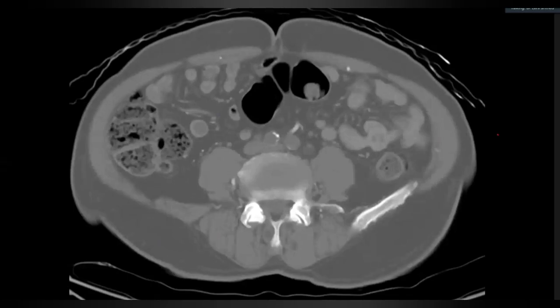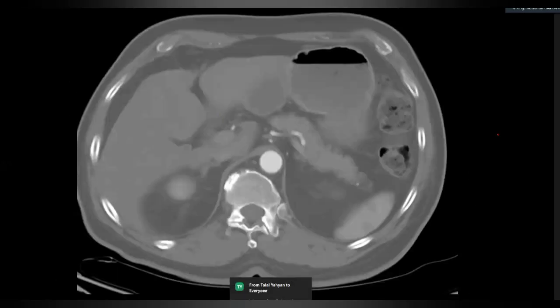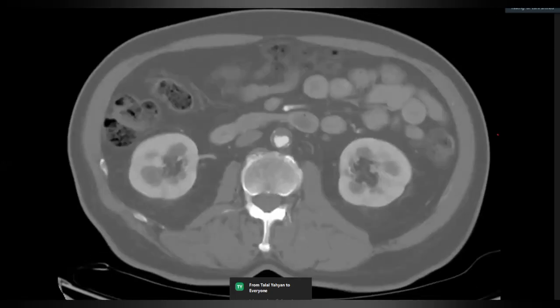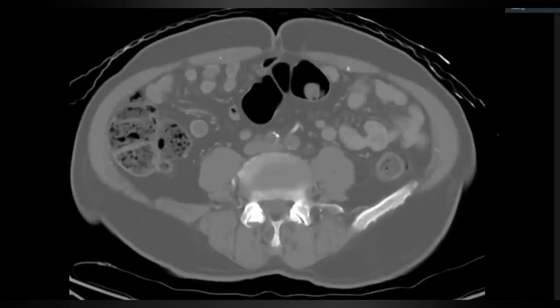Where are we now? Let me just stop for a second. I will start from the beginning. So we're just working our way from the top. I'm going through the aorta, down, down. Focus on the aorta, forget everything else. Down. Okay, so what's going on?